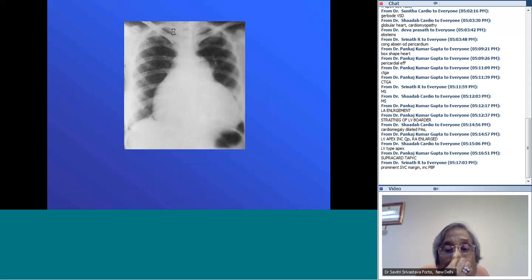Try to be quick so that we can see all the X-rays.